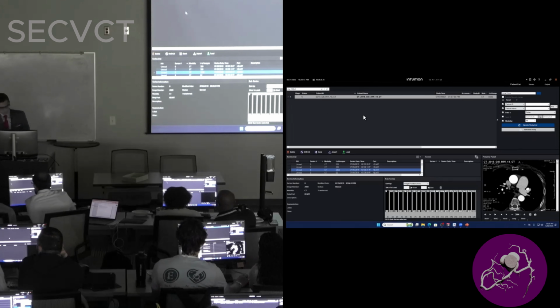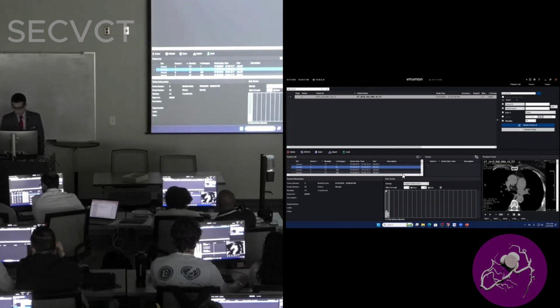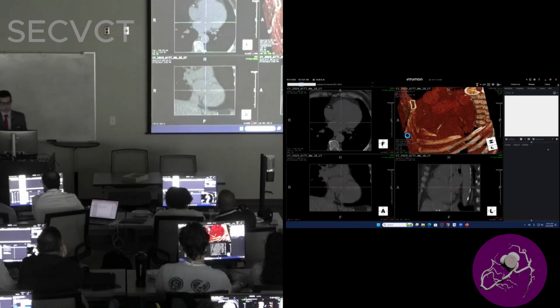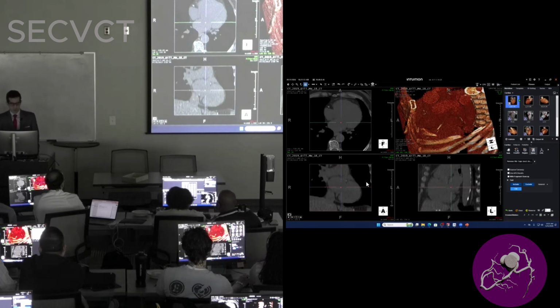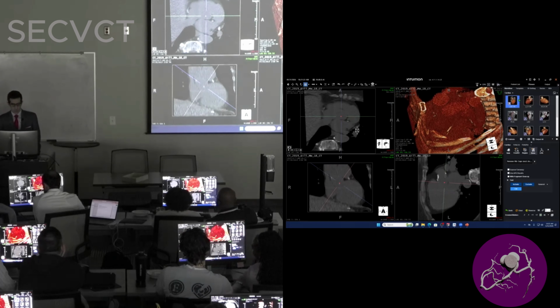And you should go and find, let me tell you which phase has the calcium score. It should be the number 52 images. Go ahead and right click, the one with 52 images. And I'm gonna, this time, just do it while you're doing it on your own. Again, you double oblique. So once you double oblique the aortic valve, say you're happy with it.